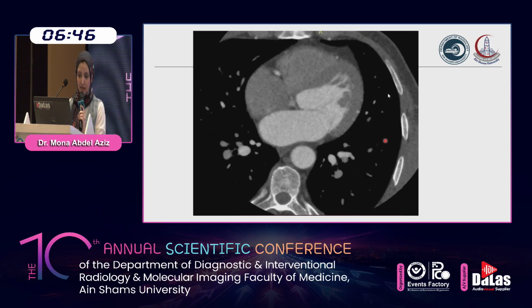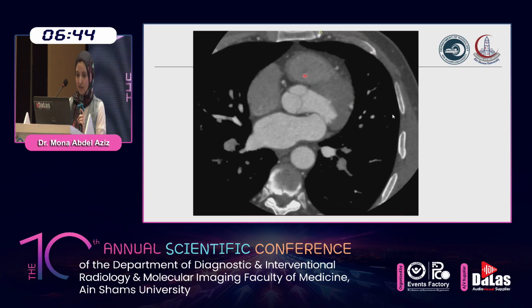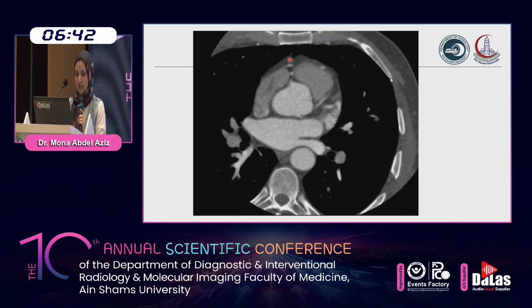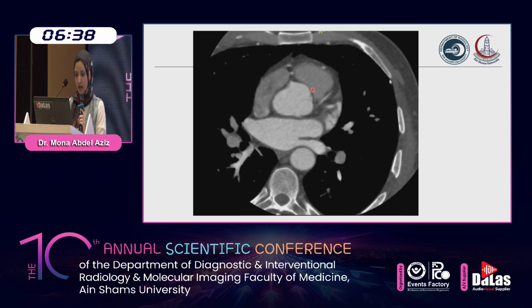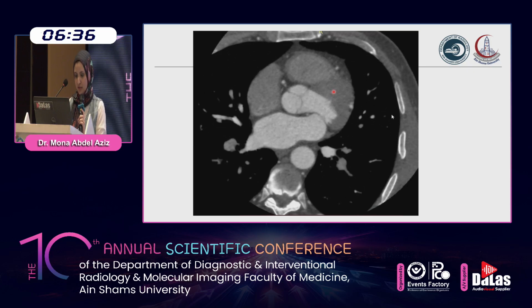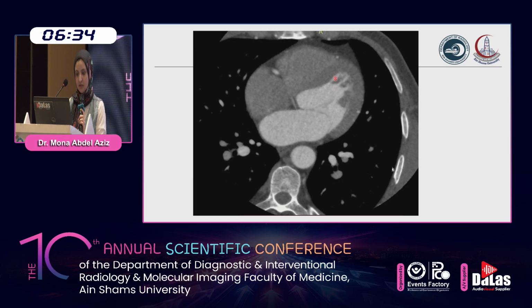So what we are having here in such a case, we have an abnormal vessel that is seen arising from the RCA and passes in front of the RVOT, and another shorter vessel which passes in the proximal interventricular sulcus. The other long vessel reaches the distal interventricular sulcus.